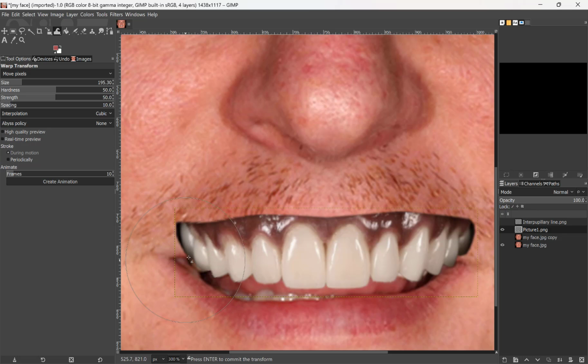All right. So I didn't quite pull this back corner as much as I'd like. There. See how simple that was? Like that just couldn't be much easier. This side, maybe I'll pull the distal inward and contract that a little bit. All right.